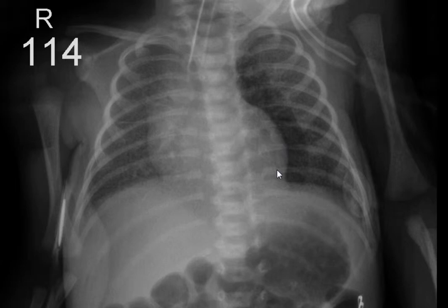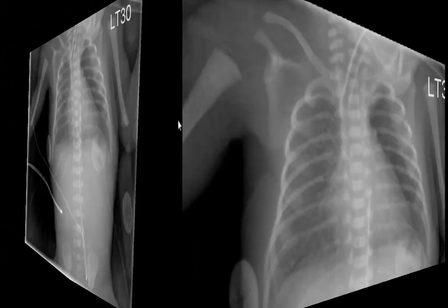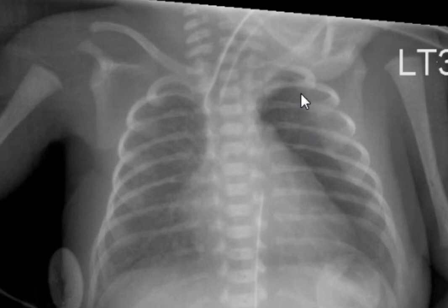This should not be confused with a pneumomediastinum, because usually with a pneumomediastinum, no matter how small the thymus is, you will see the lobe of the thymus on that side lifted up. So this is another medial pneumothorax, probably small to moderate in size. You can see the medial edge of the lung here with a hyperlucency medially, and the heart border is much sharper than the heart border on the contralateral side. So another, I'd say, moderate size medial left pneumothorax.